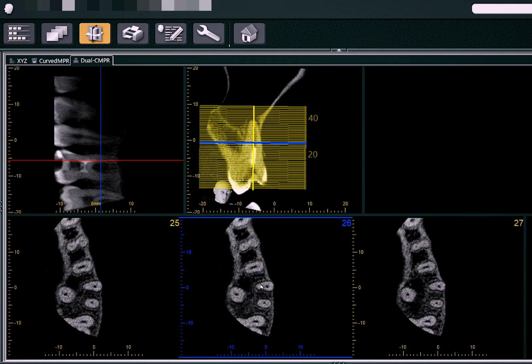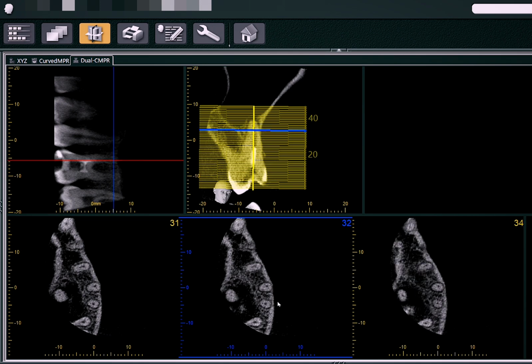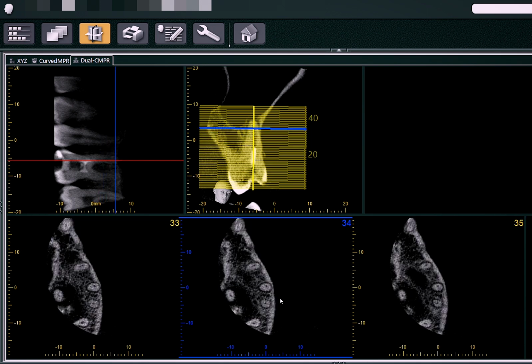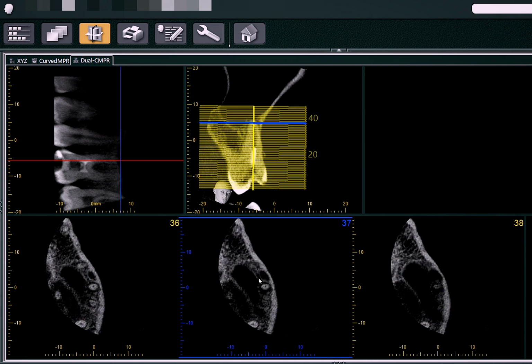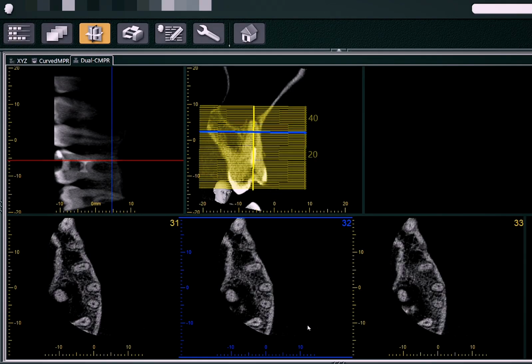Okay, so this is the tooth of concern. MB2 canal is definitely not seen. You can just search for the lateral canal wherever it is present. Just get it down apically. Okay, so once you get it down apically, you can see this is the MB canal, MB1 canal. Okay, so here again a small dot is evident. You can just magnify this and see the dots that are available, even in other cross sections as well.